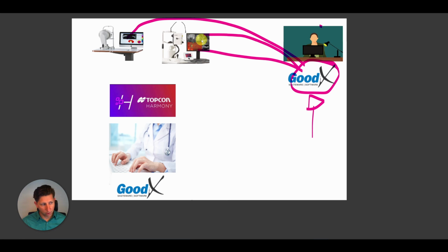You click on the work list, you click on the patient, and then you are able to then start doing the scan. If you then go to a pentacam and doing topography, there's a work list there. You don't have to enter the patient's detail. You click on the work list and you're able to start doing the scan immediately. Once the scan's done, all your imaging gets pushed to one place. So whether it's a fundus photo, a OCT, a pentacam, a visual field, and it's essentially device agnostic.